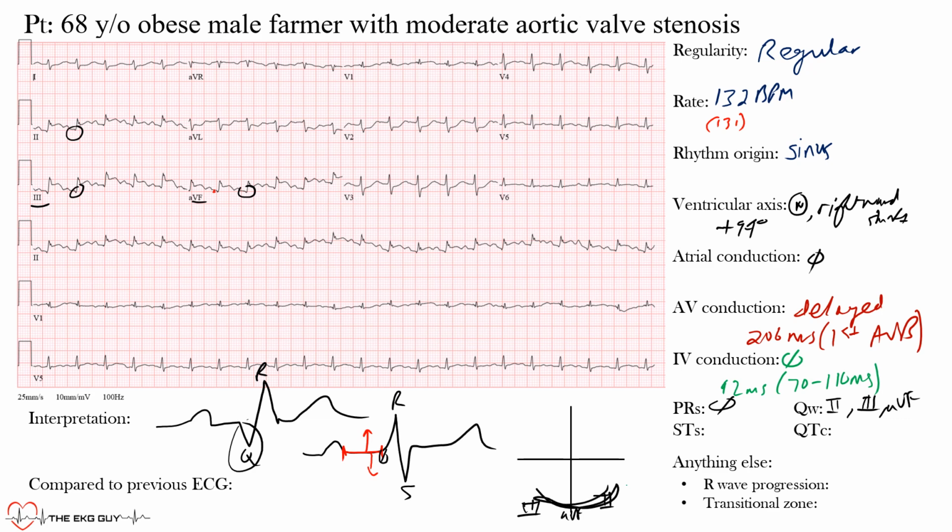Now the ST segment is this portion here.